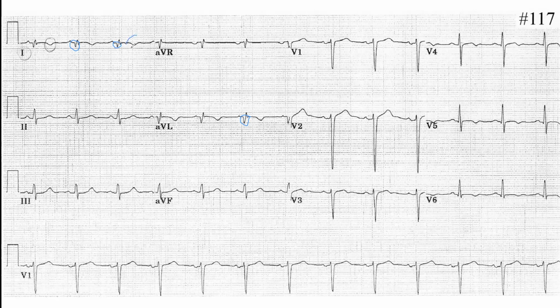However, you do see the T inversion. That can be a subacute. This is how you specify. If you have only ST elevation, that means hyperacute. If you have a Q wave and ST elevation, that's called acute. If we have only Q wave, no ST elevation, but T inversion, that's a subacute. If you have only Q wave, that's a definitive or old MI. Okay?